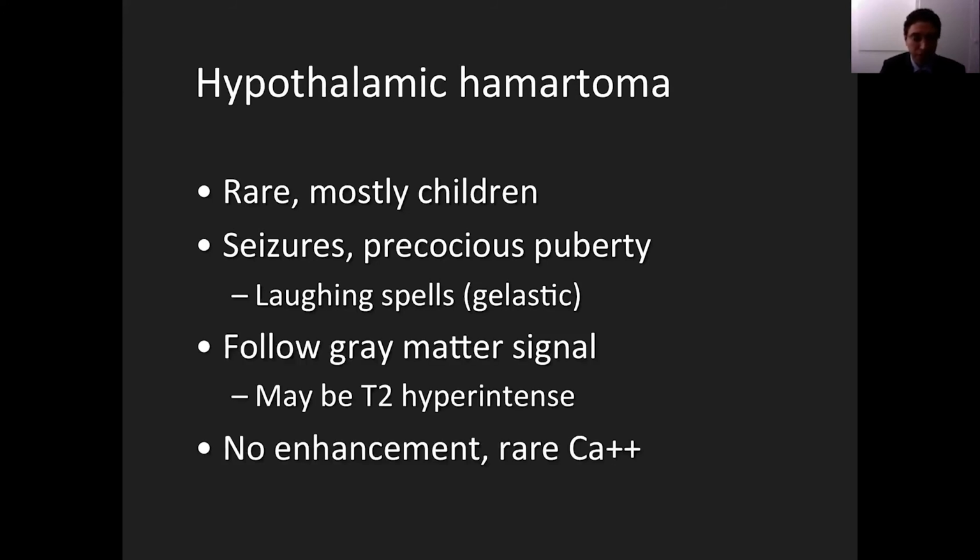For the most part, they do follow gray matter signal, but they can have hyperintensity on FLAIR or T2-weighted images depending on their content of gliosis. They should not enhance, but some of them can have calcifications.